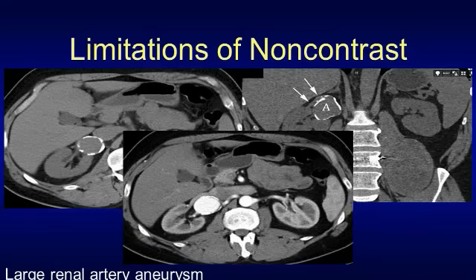Second patient, we see a peripherally calcified mass arising from the medial right kidney. That could be a cyst, but it's not because it's actually an aneurysm. Now, this is where the coronal multiplanar reconstruction is your friend. When you're on at night, always look at the coronal reconstruction on these cases, because look at this case. You can see that this aneurysm is coming off of the artery. It's not even arising from the kidney. So you shouldn't even suspect this is a cyst. You should be concerned that it's an aneurysm.